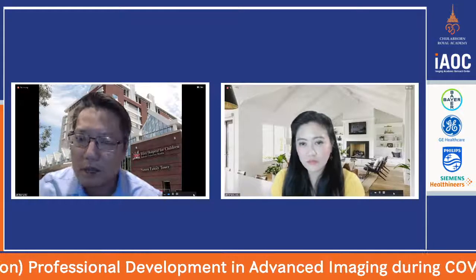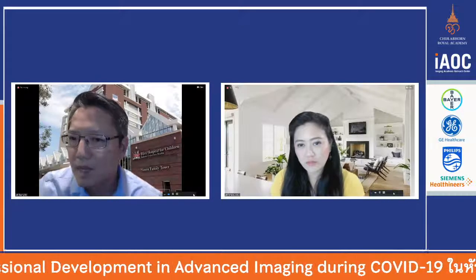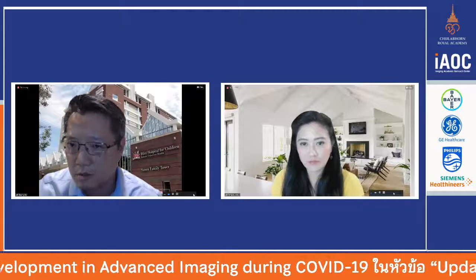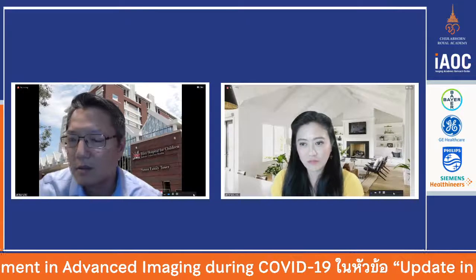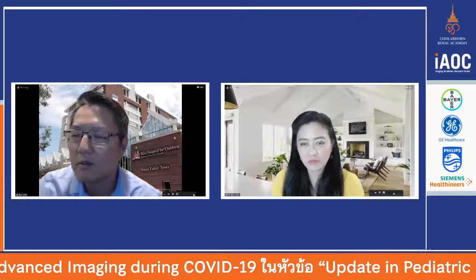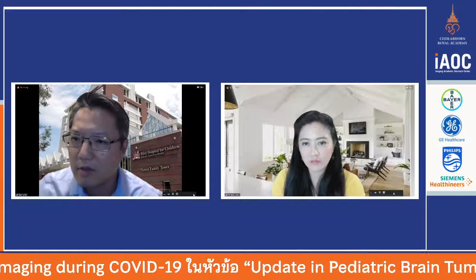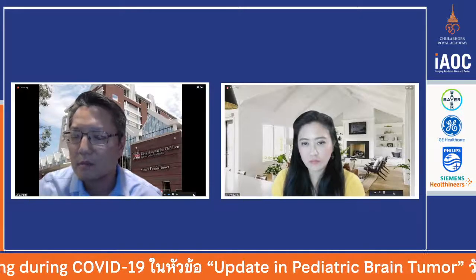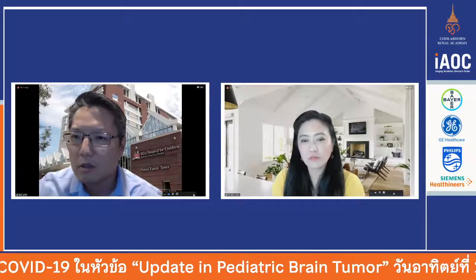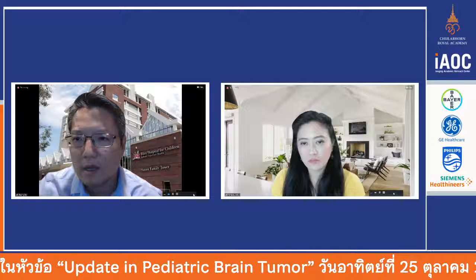And for the H3K27M mutations, anytime you're dealing with a T2 bright tumor in the midline, always suggest it. Encourage your neurosurgeons to get a biopsy if they can safely do so, because if you do find that mutation, unfortunately there's no good treatment for it currently, but at least you can counsel the patient and give the family an expectation of what's going to happen.